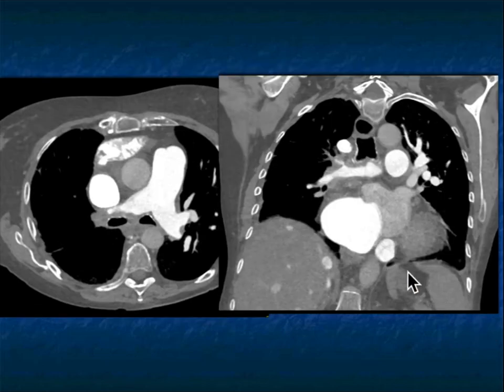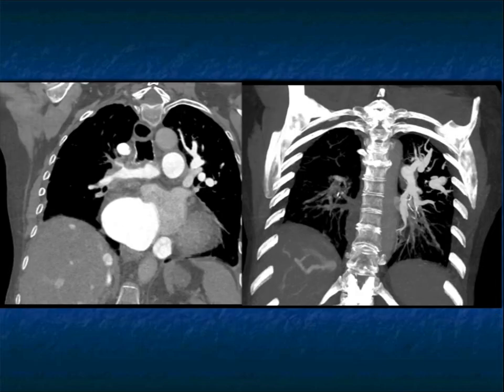And then you look further and you say, look at this infiltration around the patient's right main pulmonary artery, but the upper lung branches are particularly narrowed and really encased. Here it is again on that view. And then when you look at some of the MIP imaging, you see the pulmonary arteries on the left, but on the right, there really is no pulmonary artery of any note to the upper lung region, and the rest of the pulmonary artery is small on the right side.